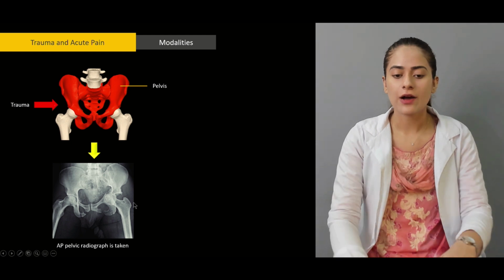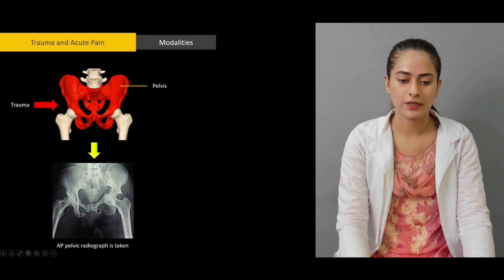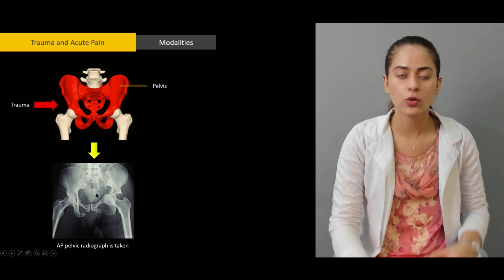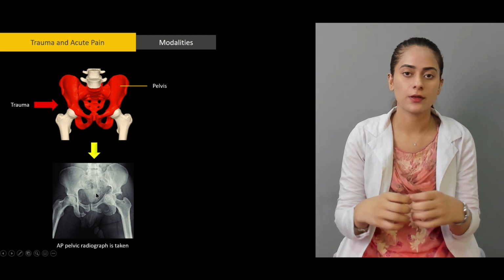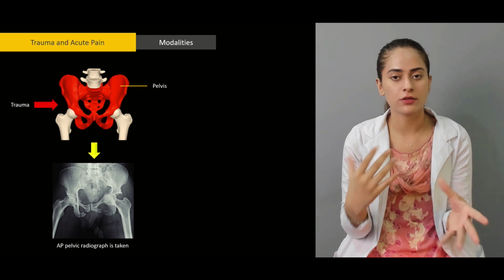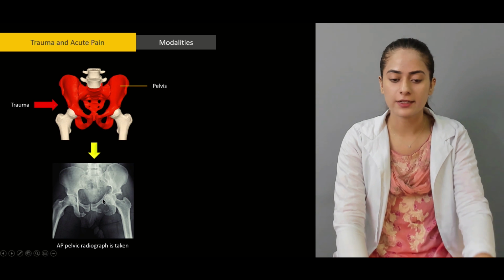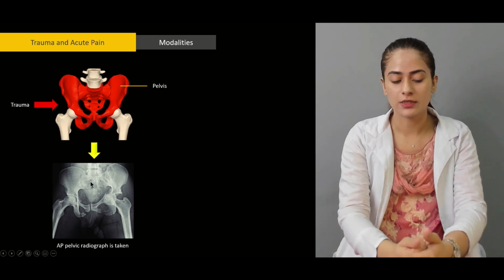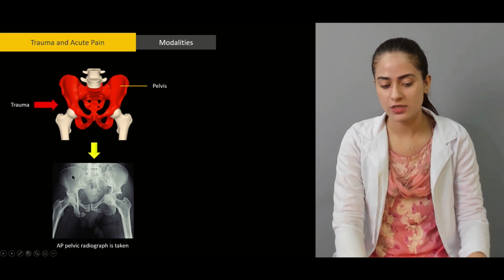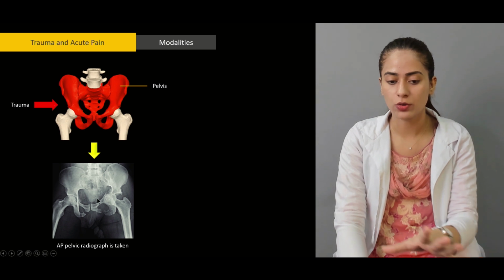Here we can't really comment on whether it's probably a male pelvis. In a little bit we're going to discuss the differentiating features of a male and female pelvis. For now, let's just ignore that and focus on differentiating normal from abnormal. So this is an abnormal X-ray, and there are multiple fracture sites.